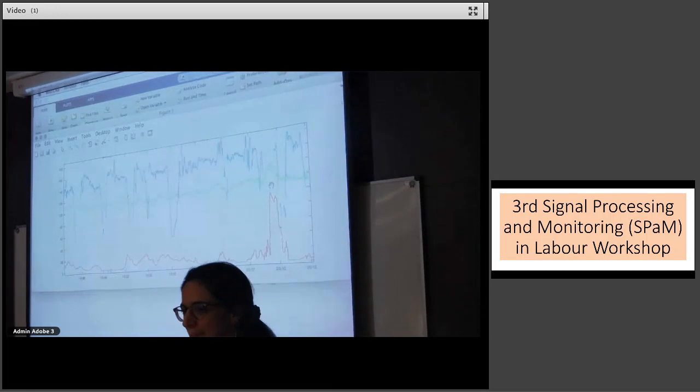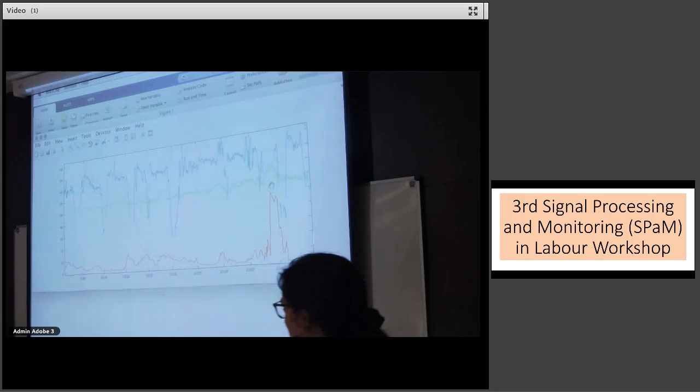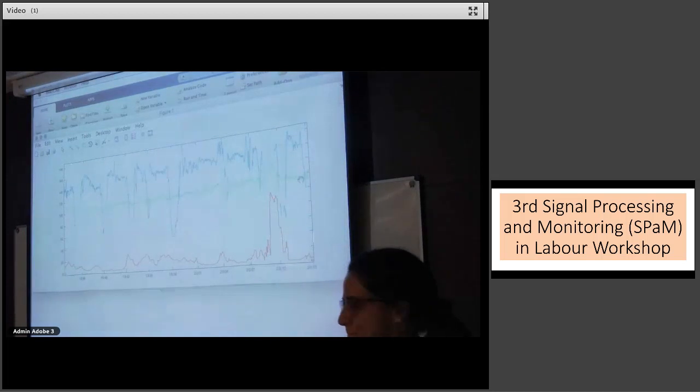I agree with that. My reassurance comes from the fact that the variability is still very good, and the interdeceleration interval is still fine. So could we agree that we are a little bit more worried than we were before because the baseline has gone up just a little bit, and the amplitude and duration of the decelerations has increased? They're related. But we're still pretty sure that the baby is coping well with the contractions and with the cord compression that's probably happening. Correct.